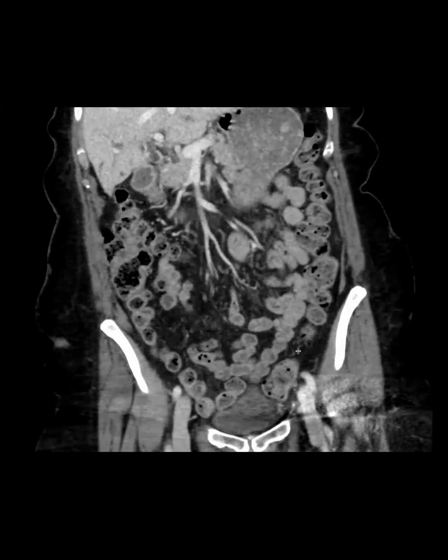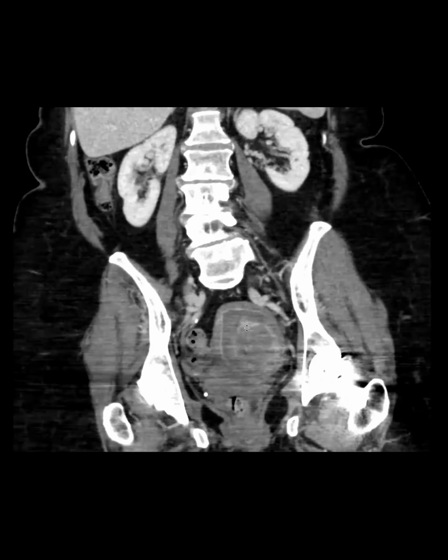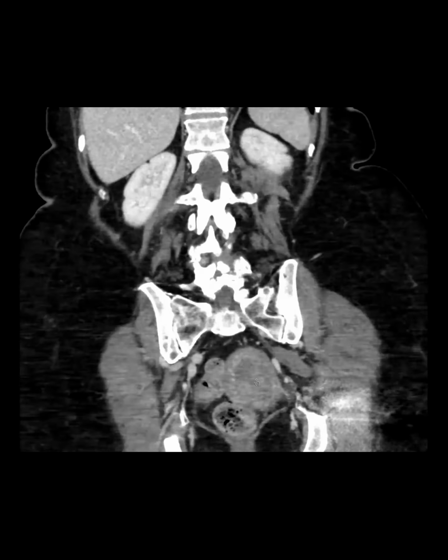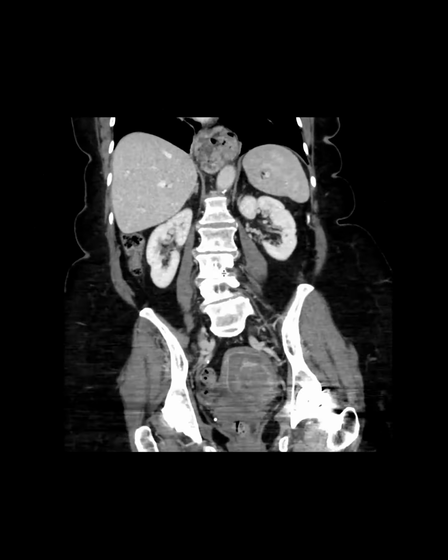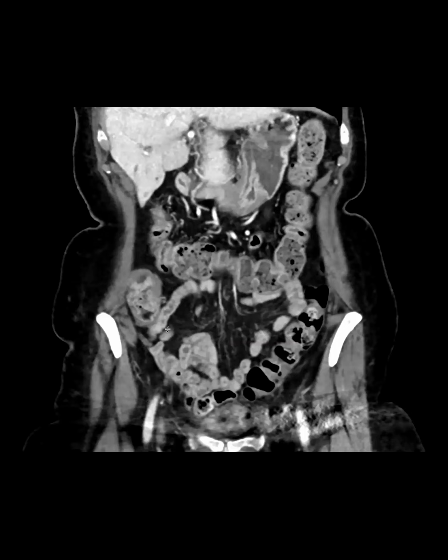This is the patient who presented with this. Obviously a mass in the endometrium. Patient also has a history of breast cancer. And then now, this is resected and came back as endometrial cancer, and then had follow-up. Did they have BRCA, Nelly?